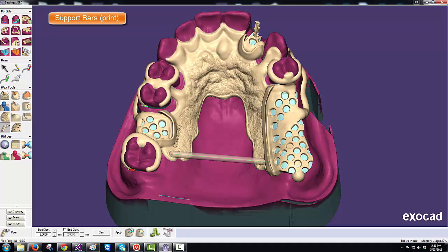And we use this support bar for the printing resin option, so that after the resin parts are cleaned, they don't warp in the light. You may have to T support bar certain partials. In the best practices, we have pictures of various partials that you can use for a reference.